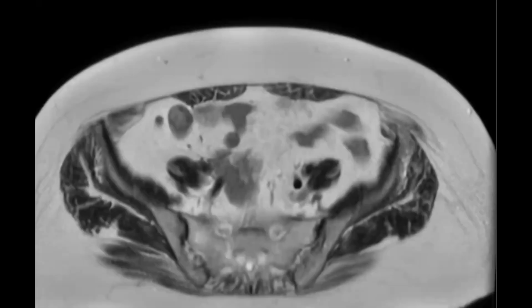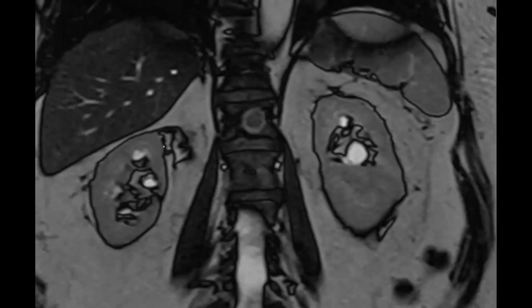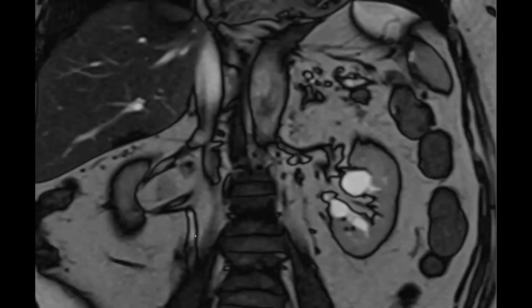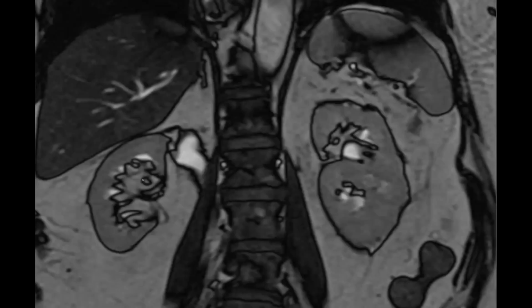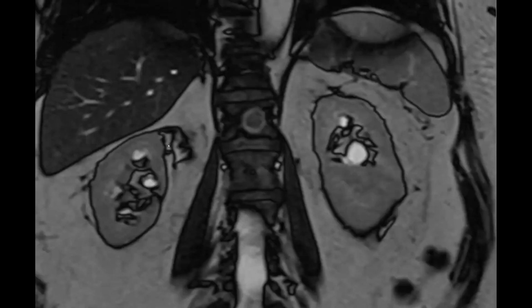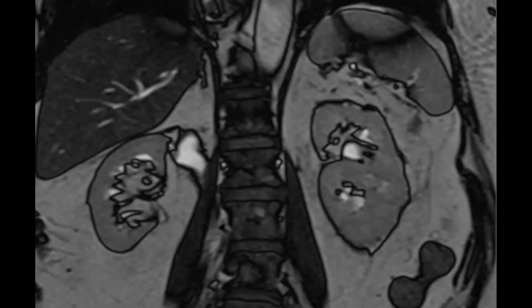And so if we look back, we had some prior imaging that showed there was a kidney here, but there was a really atrophic upper pole moiety with a dilated ureter here. So this was a nice Weigert-Meyer rule. So there's a duplex or duplicated kidney here. And the upper pole is inserting ectopically on the vagina and therefore was obstructed and caused chronic severe hydronephrosis and then eventually atrophy of that upper pole moiety. So usually in Weigert-Meyer, the upper pole moiety is ectopically inserting and obstructs, and the lower pole refluxes.